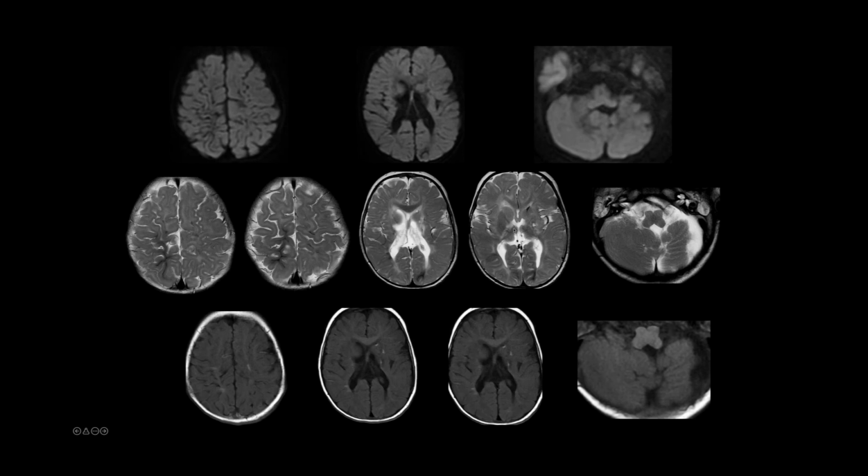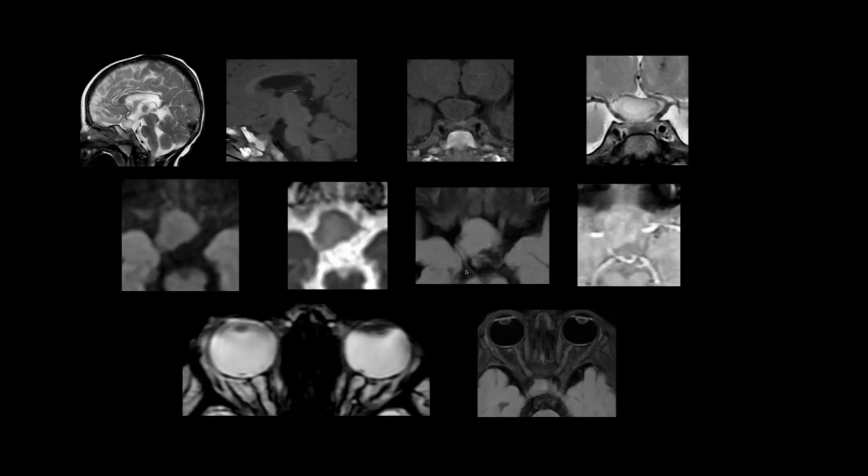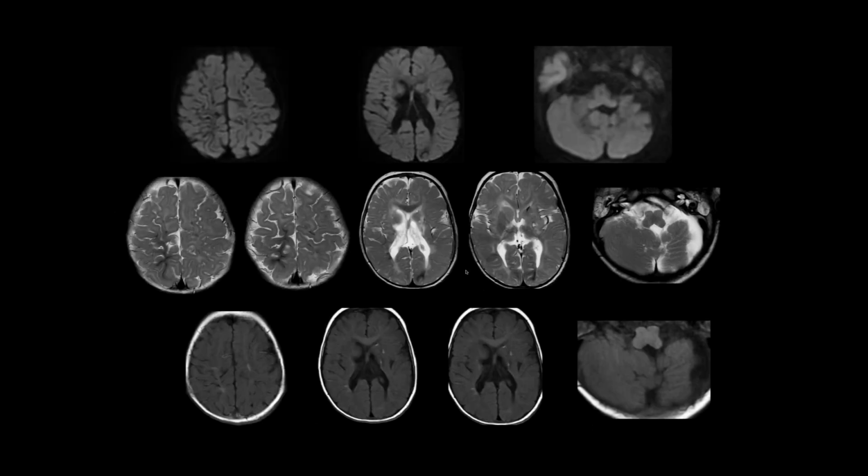There's volume loss of the thalamus also. So these are all related to old injury. Whether it was an acquired injury or something with a genetic disorder causing this is the question. I don't think there's a relationship between the tumor and the parenchymal changes. Yeah, it's just so odd for a small baby to have a tumor and these changes, so I'm just wondering if one could knit them together.